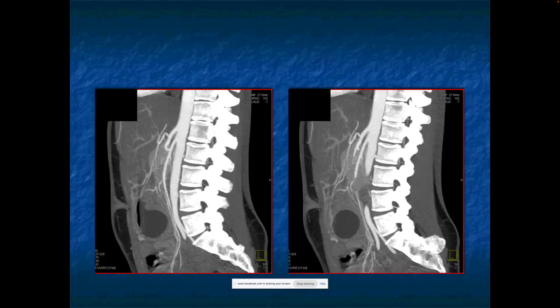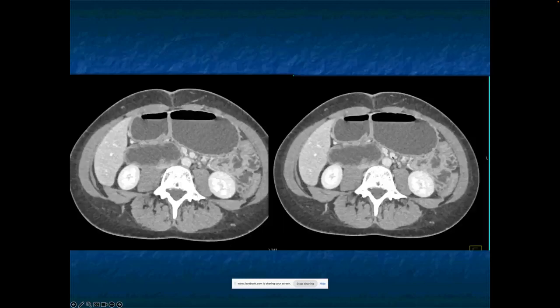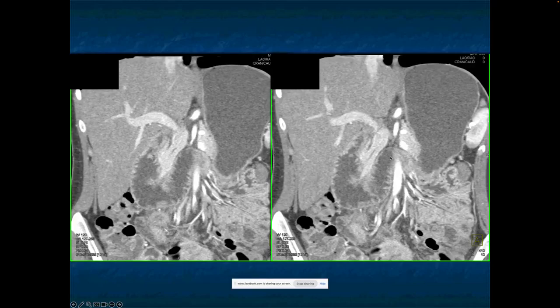You see the angle and compression of the left renal vein again. But look at the duodenum as it comes across, it's dilated, and it changes. Transition point is where the SMA is. Remember, two things go between the SMA and the aorta. That's the left renal vein. It gets compressed, so you have nutcracker phenomena.